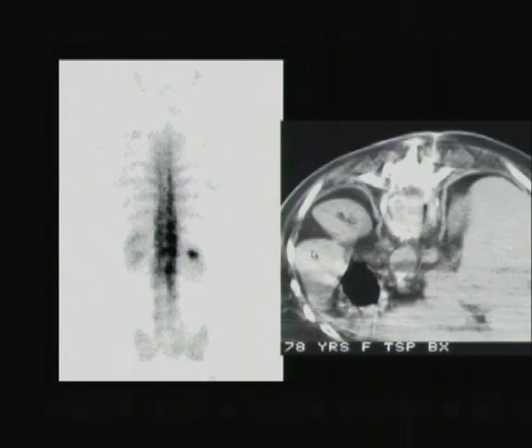And this patient was a medicine patient, so they called me. They said, we have a patient with metastasis, possibly, the age goes for it, and the MR goes for it. I said, let's see it. I tried to resist. They showed me this, and I couldn't help it, and I did a biopsy. But I don't do a biopsy on these patients anymore. This is fluid. And when you see fluid, this is usually a benign process. It's not a metastatic disease.